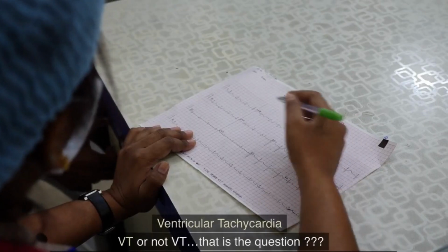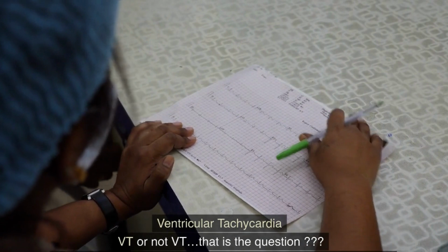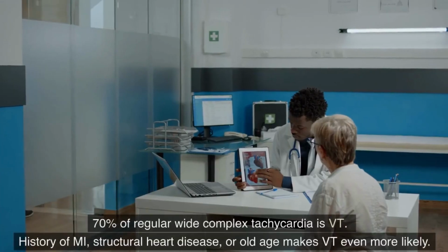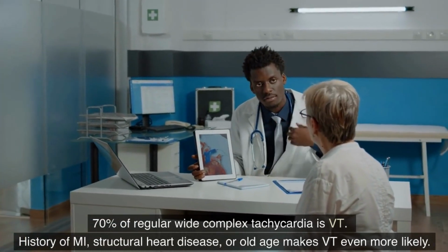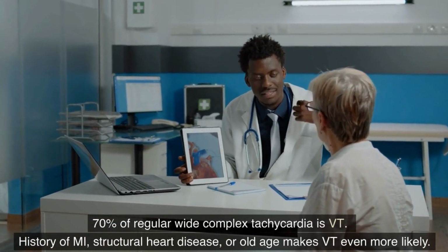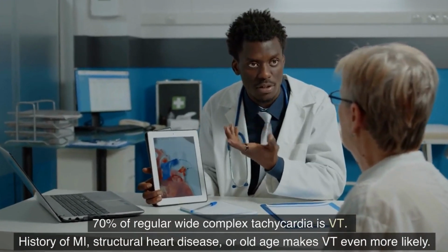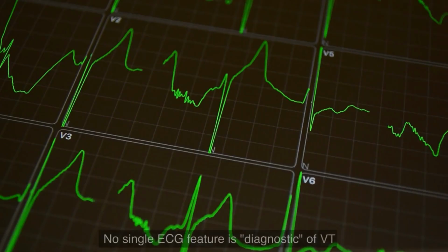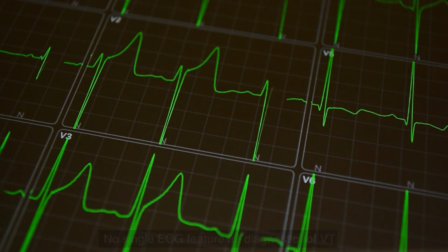Ventricular tachycardia, VT or not VT? That is the question. Before we start, here are a few things you must know about VT. 70% of regular wide complex tachycardia is VT. History of MI, structural heart disease, or old age makes VT even more likely. No single ECG feature is diagnostic of VT.